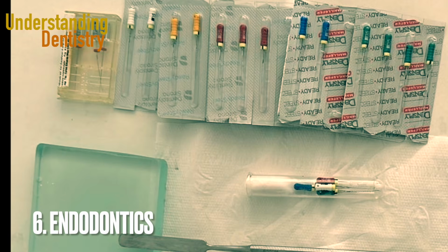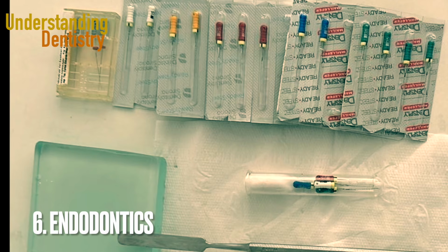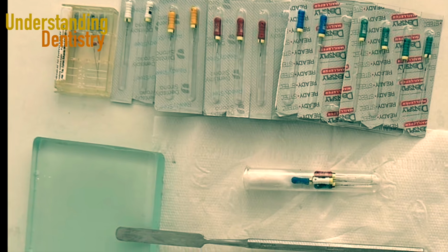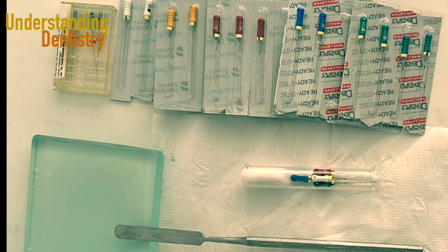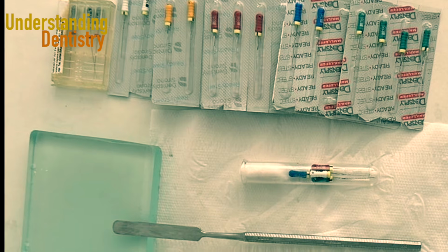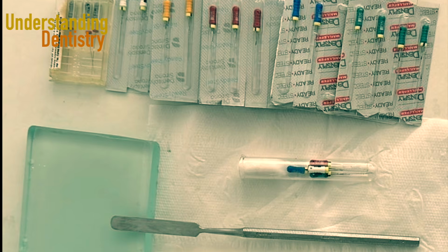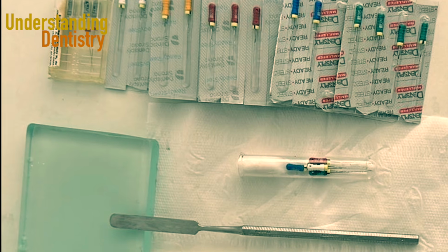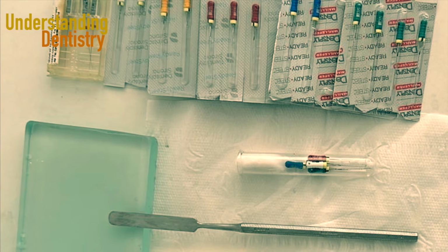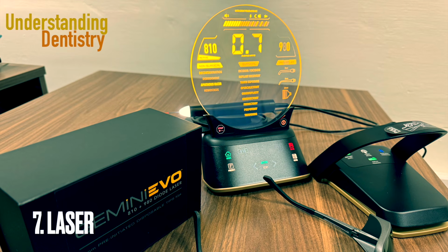Just for the endodontics not to be so sad, we also have the endodontic materials, the endodontic files, and you guys have different types of files with different functions and different usefulness, all right? So you are going to use them to treat the root canal of the tooth. The tooth will most likely be isolated with the rubber dam, okay, so that you have good conditions to treat this root canal. There are also rotary instruments, okay, and a series of other digital instruments used for endodontics.